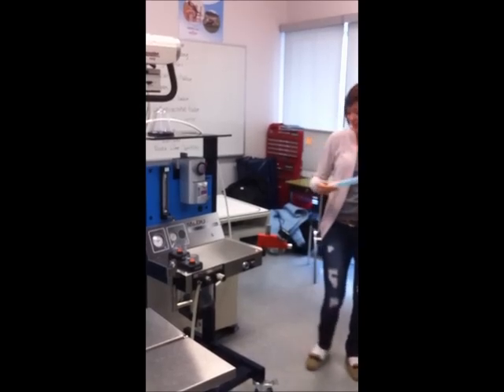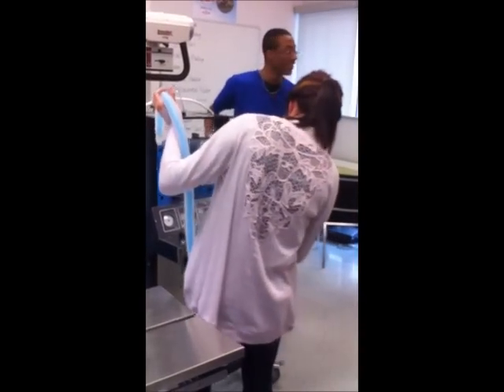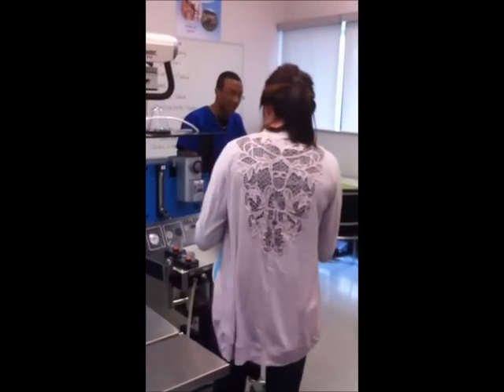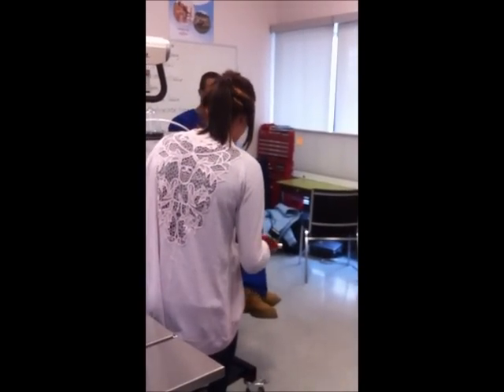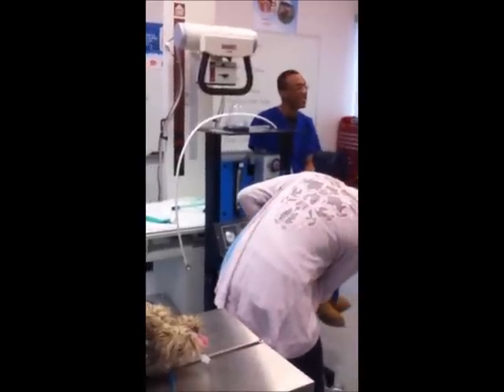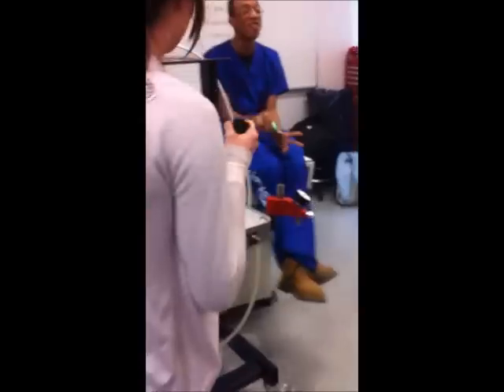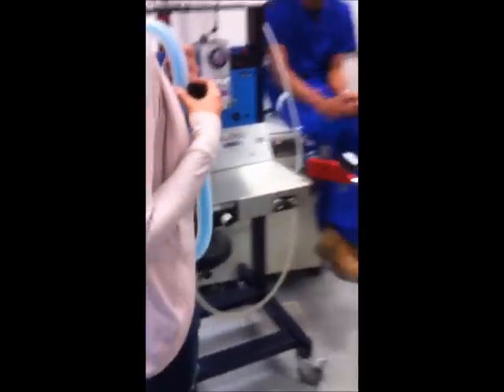Okay, so I don't know how to hook that up anyway. Come on, guys, help her out. You have to do the other tube first. That tube. And it's U-shaped. I like that. I bet everyone's going to remember that now. U-shaped. Then another one goes on. See the red circle? Plug it in.